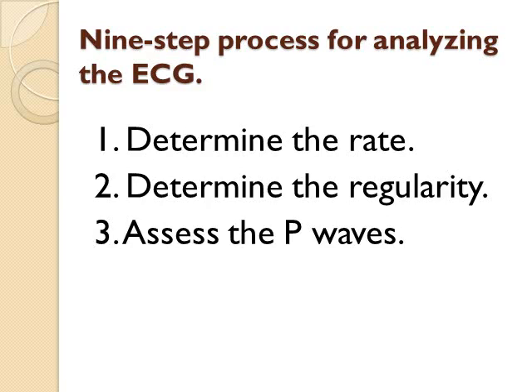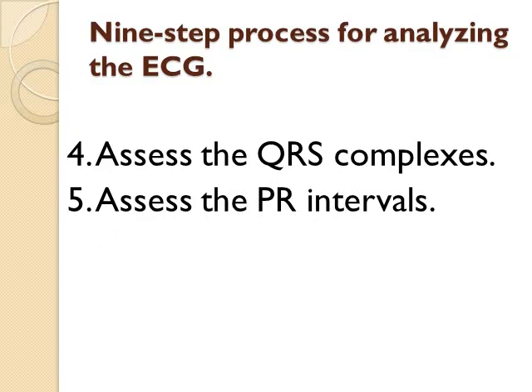And second is determine the regularity of the heart rate. Is it regular or irregular? Third is assess the P waves. Is there a uniform P wave preceding each QRS complex? Then fourth is assess the QRS complexes. Are the QRS complexes within normal limits?